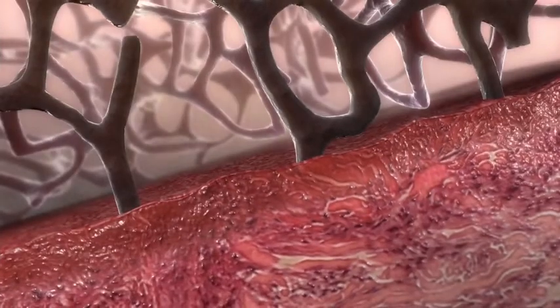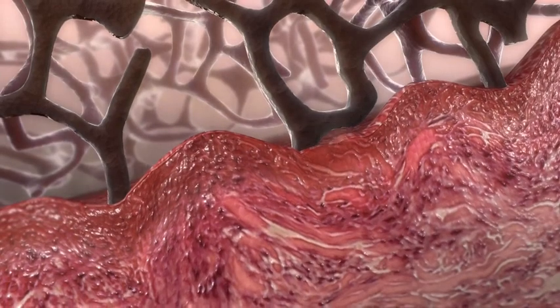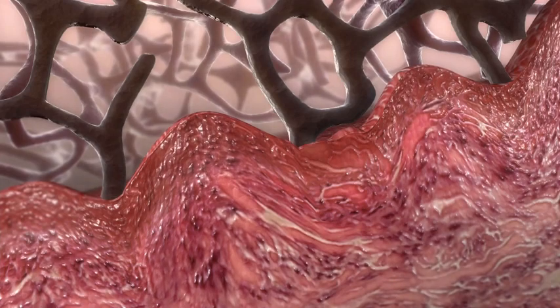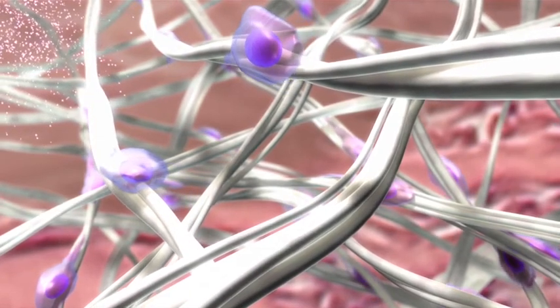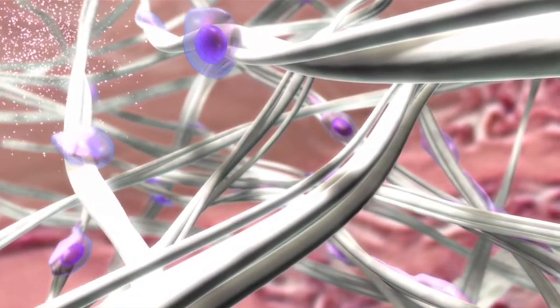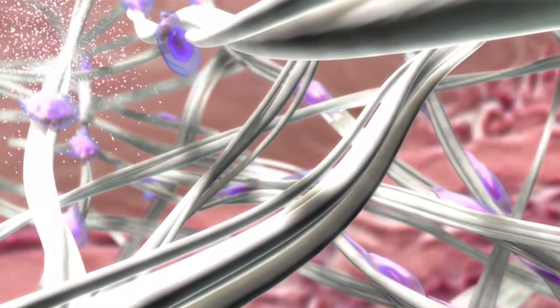The effects of the biological response are initiated by microstrain, which results from the manifolding of negative pressure across the proprietary granufoam dressing to the wound surface. This creates areas of cell surface strain, also called microdeformation. Tissue microdeformation at the cellular level leads to cell stretch. When cells of any kind are stretched, they are stimulated to expand, become thicker, and more metabolically active. This response to cells stretching has been well documented and is clinically used, for example, when tissue expanders are applied to stimulate the formation of new skin.